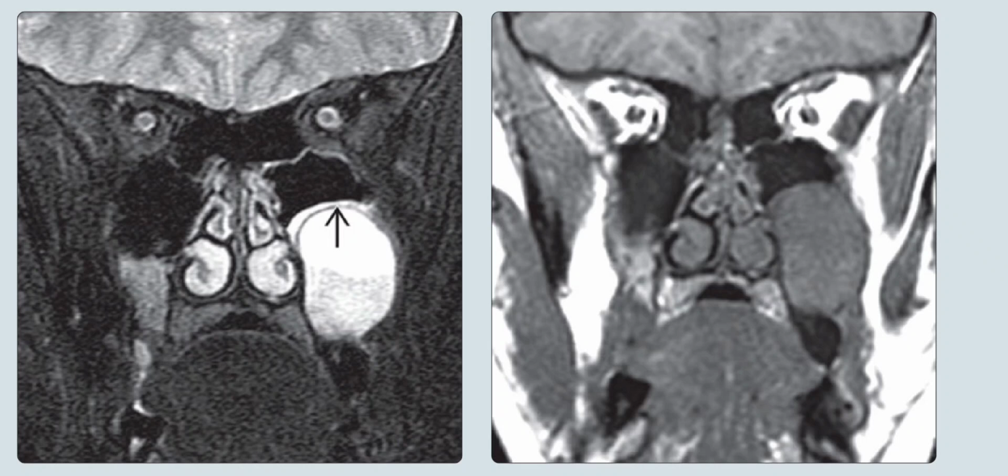Now we are going to describe the imaging findings of the basal cell nevus syndrome. So these are the cases of basal cell nevus syndrome. The T2 weighted MRI of a classic basal cell nevus syndrome shows a large unilocular T2 hyperintense cyst which is arising from the left maxillary alveolar ridge. This cyst is bulging into the maxillary sinus, displacing the floor of the sinus and secretions superiorly.